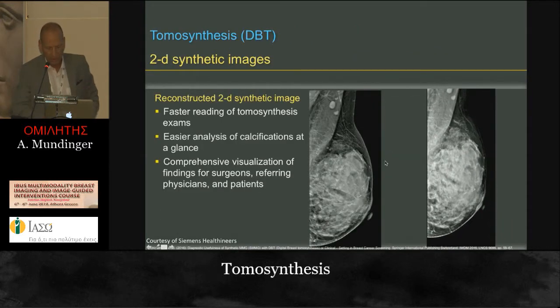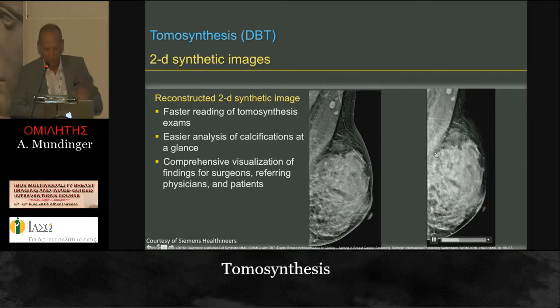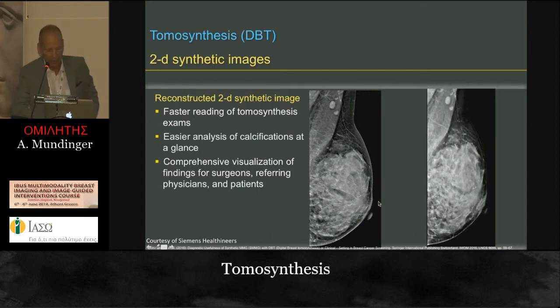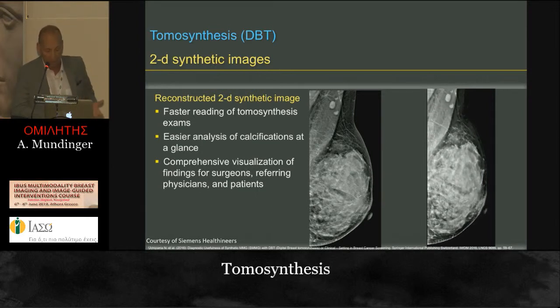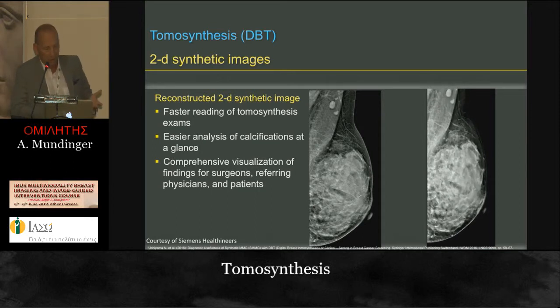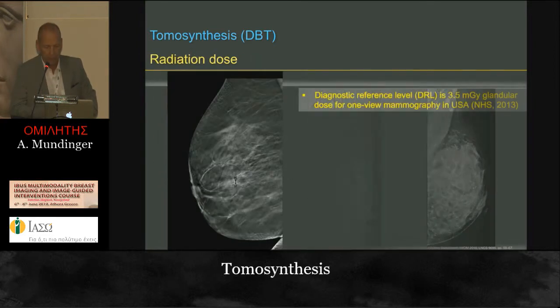And this is how the modern 2D images can be scanned on a monitor. It just moves, and this movement helps to better delineate the calcifications. The synthetic images are much better for a faster reading of tomosynthesis, and they give you a comprehensive visualization. It's very similar to your normal analog or digital mammography.